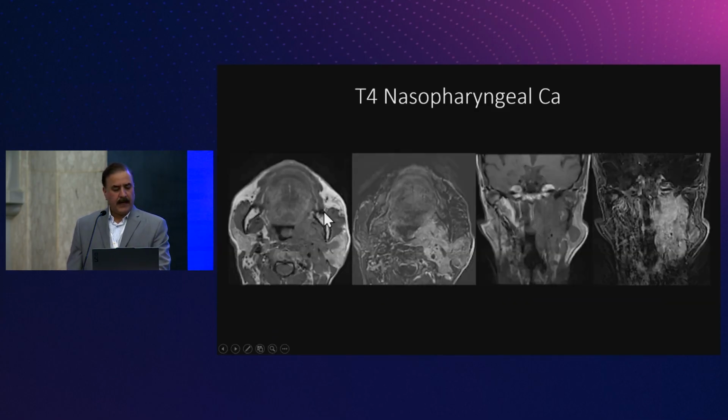Here you can see big, huge nasopharyngeal cancer extending posteriorly, carotid sheath, but we are seeing the tongue of cancer extending into the superficial lobe of that parotid gland. Parotid gland involvement by an NPC is T4 disease. Another case where you see extension into the oropharynx and actually going down into the hypopharynx, that's T4 disease example also.